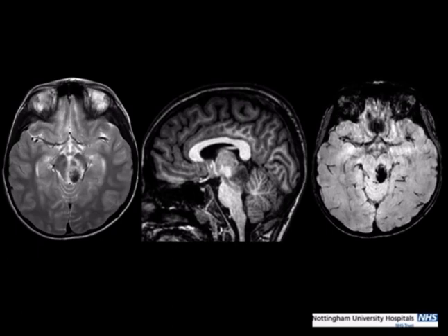Again, talking about blood and its evolution of signal, this is a child who is on prednisolone for ulcerative colitis, came in with a chickenpox rash, and then started complaining of ataxia and diplopia. There's a T2 hypointense lesion in the dorsal left midbrain, T1 hypointense, but again, the susceptibility weighted imaging helps you out here. This is hemorrhage, and this is hemorrhage in its deoxyhemoglobin state.